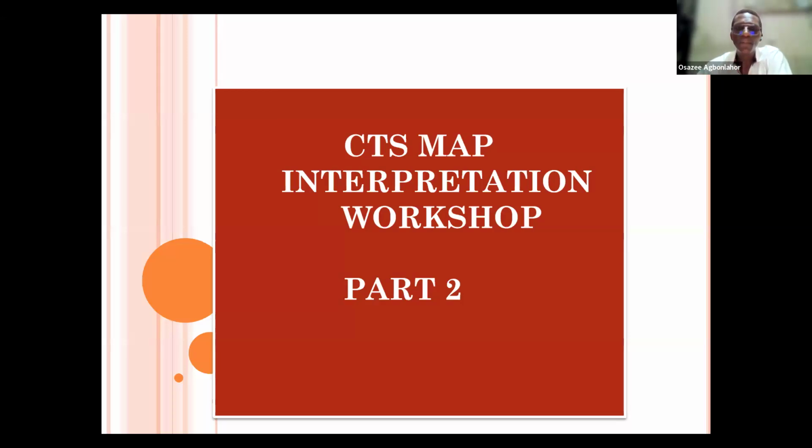So please pardon me. So now we're going to be looking at the interpretation proper.